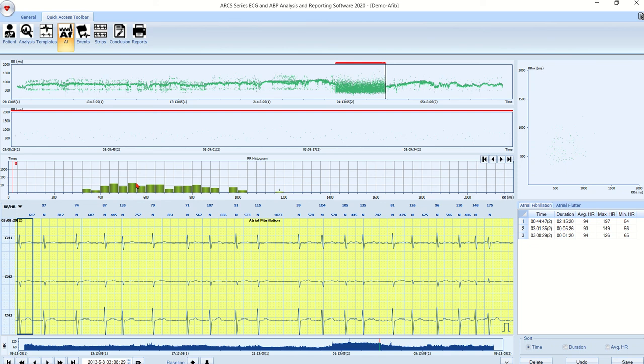Welcome to the fourth ARCS 2020 educational video section. In this section, we're going to review the patient's Afib, or what the Afib page in the application looks like.